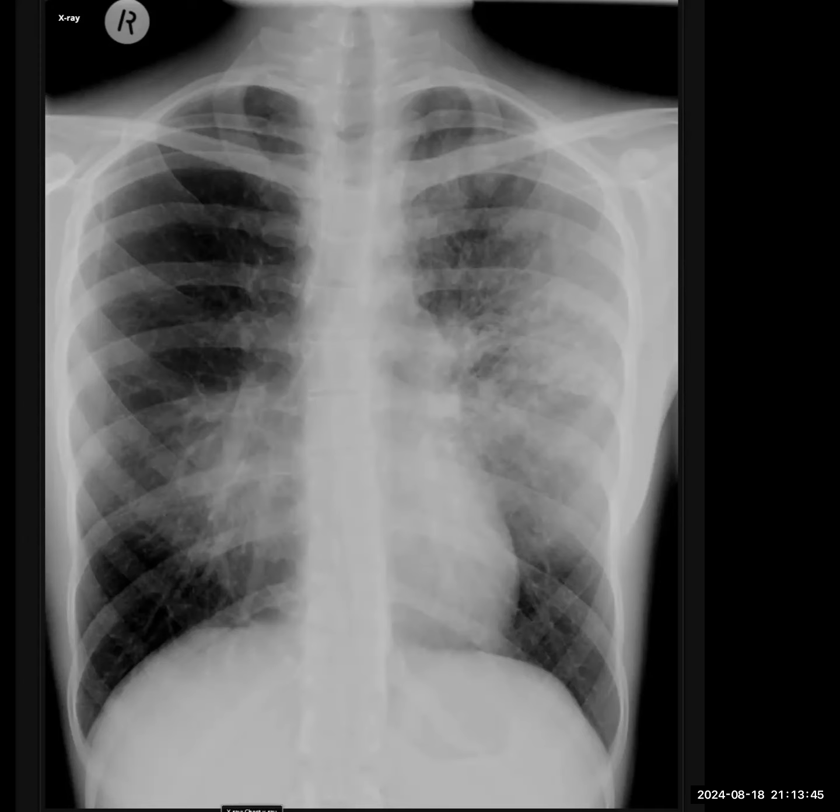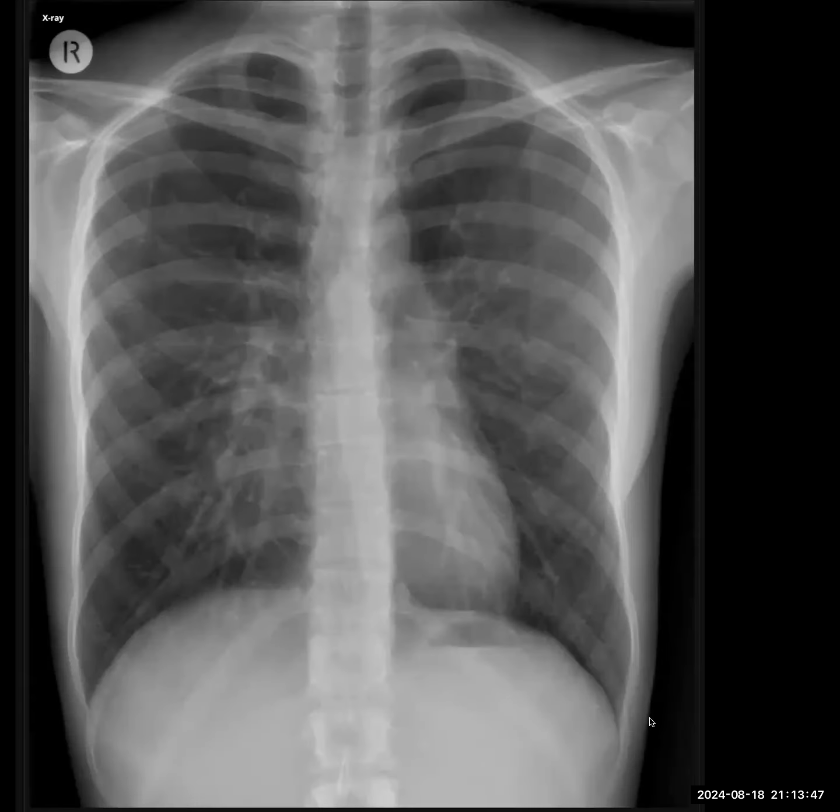So I'm giving you a follow-up X-ray. Okay. This was taken 6 weeks later. On the follow-up X-ray, I can see that the previously visualized areas of consolidation are not present. So I think this is healing of the process. I'll convey these findings to the referring clinician, and the patient needs to be stopped for any treatment she is kept on.